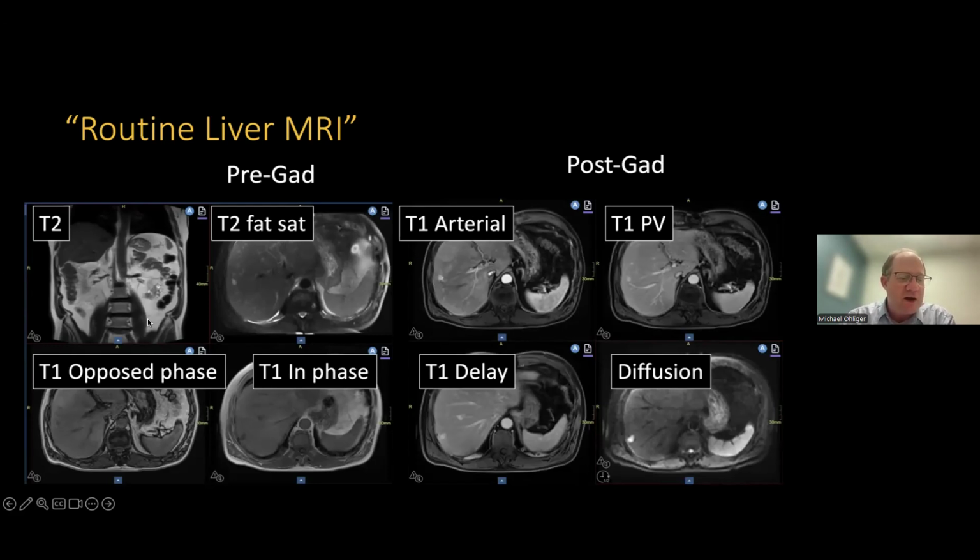You can actually see the aorta. So for looking at anatomy, basically, what's there? Is anything obstructed? Is there anything wrong? Really, this T2 without fat saturation, as you look through our exams, is really going to be your friend. The fact that you see the fat allows you to delineate image planes. So the most accessible image is actually going to be this.